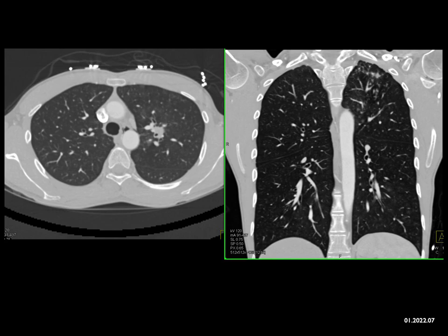MAI infection, typically lower lung, middle lobe, not apex. Coccidiomycosis can give you nodules, but usually more discrete nodules. Again, history of infection would be good. COVID-19 involves the mid to lower lung fields typically with this mosaic pattern. It's not this nodular type pattern.